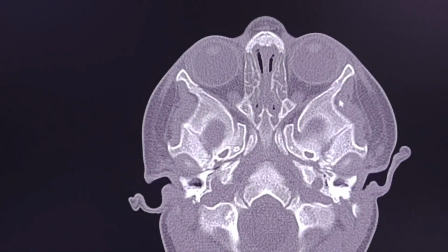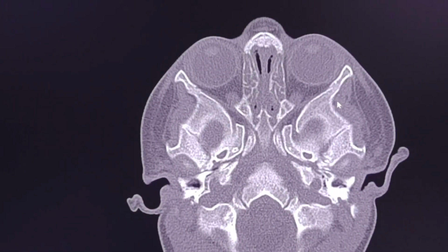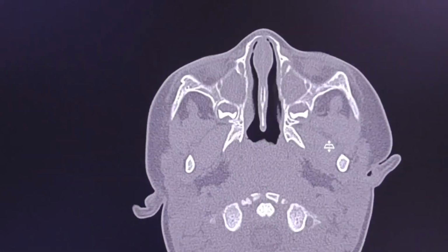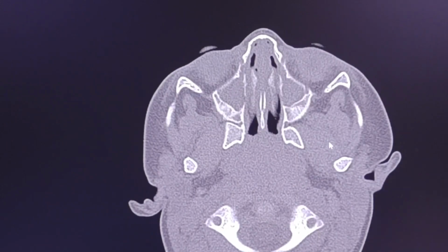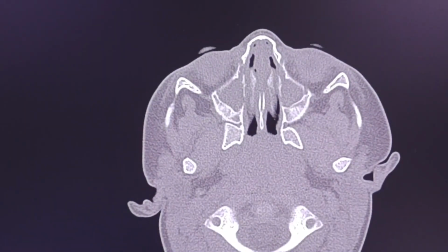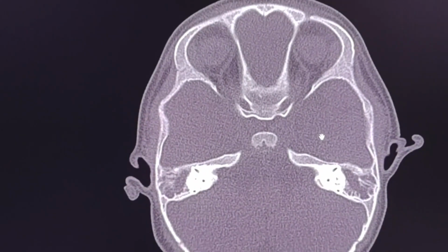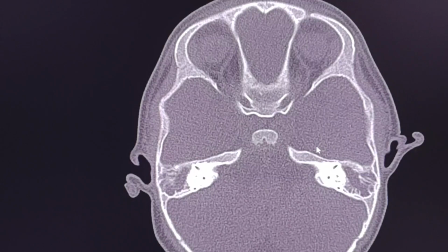So, as radiologists, how can we manage findings like this? According to the literature, incidental mastoid and sometimes middle ear opacification is a common radiologic finding and source of referral to otolaryngologists.